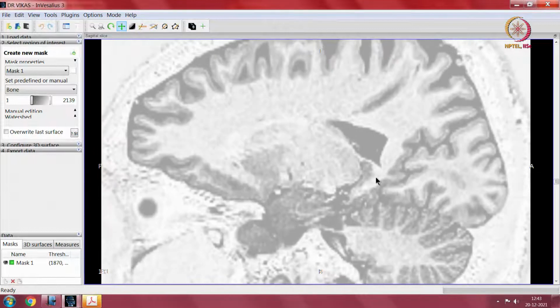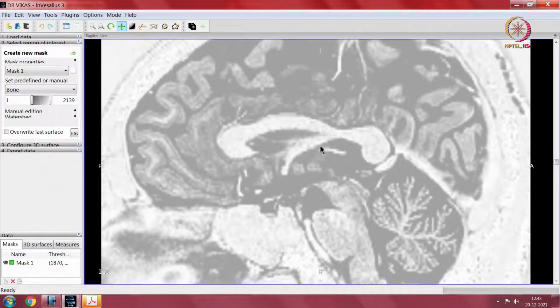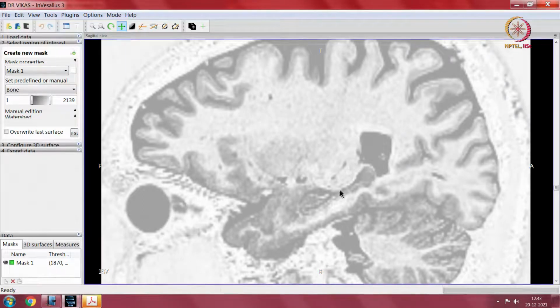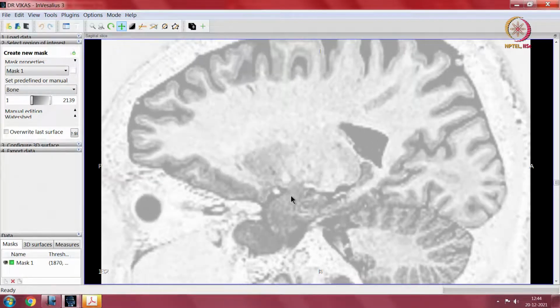The hippocampus curves around the thalamus and forms the fornix. So, this is the fornix. Can't make out very clearly where it is curving around, but if you go laterally, you would find that it is going into the hippocampus. Just above the hippocampus is the other structure which I wanted to highlight. Please remember, this is sectional anatomy. This gray structure over here is the amygdala, and the amygdala is closely related to the lentiform nucleus over here.